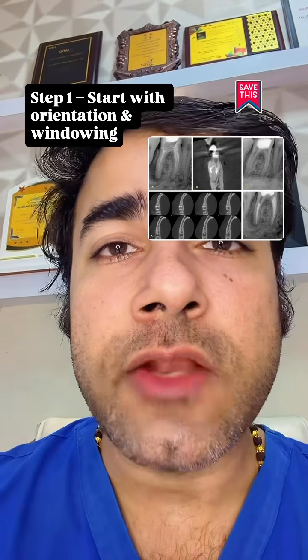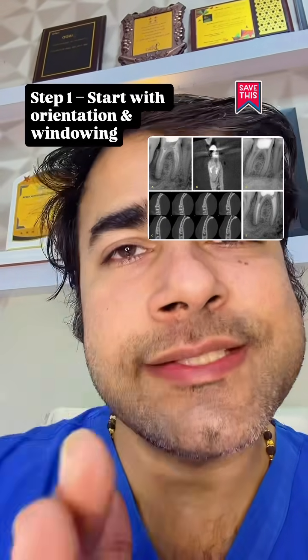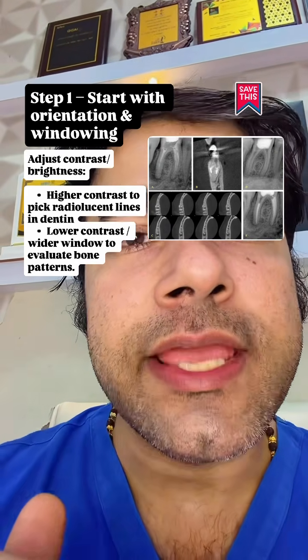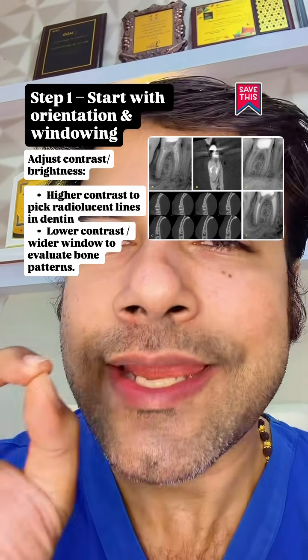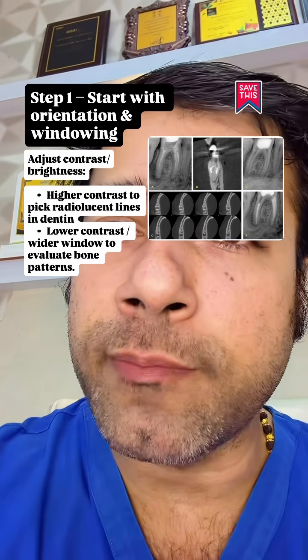Step 1. Start with orientation and windowing. Verify the tooth and side. Align the planes along the tooth's long axis. Adjust the contrast and brightness. Higher contrast to pick the radiolucent line in dentine. Lower contrast or a wider window to evaluate the bone patterns.